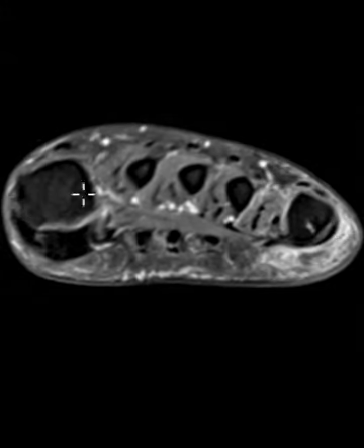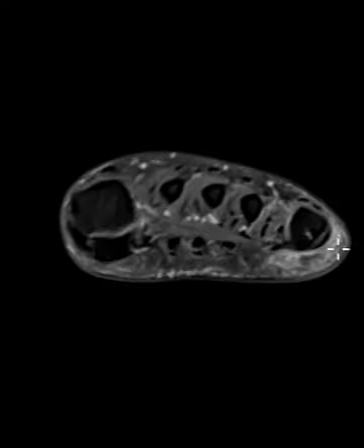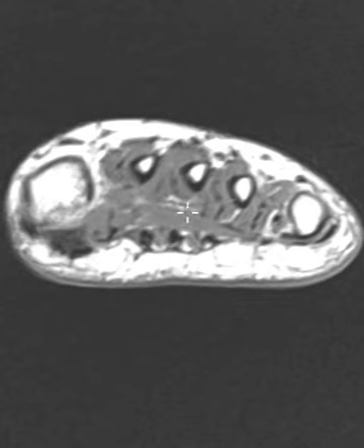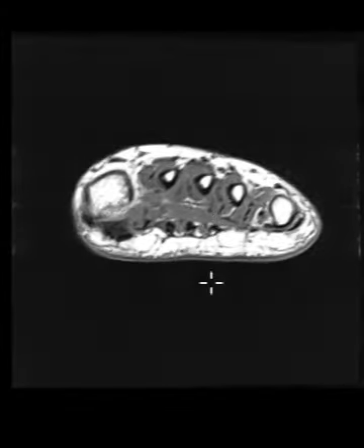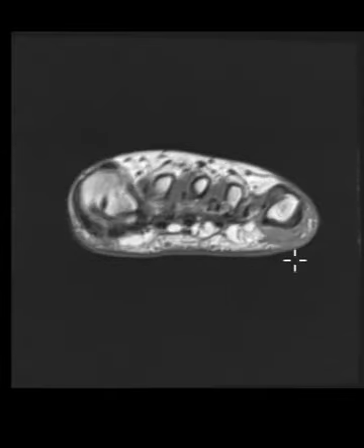So this is the great toe, the fifth metatarsal head area, and this is the edema and swelling of those soft tissues. This is again one of those fluid sensitive sequences. But on this view, the T1 weighted sequence here is very good to look at this. This is a short axis view where subcutaneous fat is bright. Here's that fifth metatarsal head. Now we're going to go forward, or more distal rather.